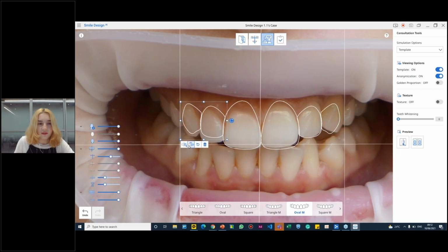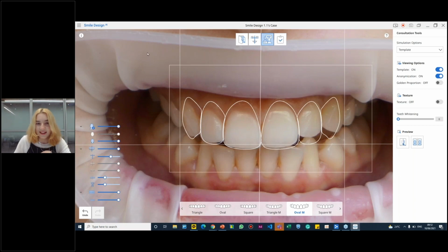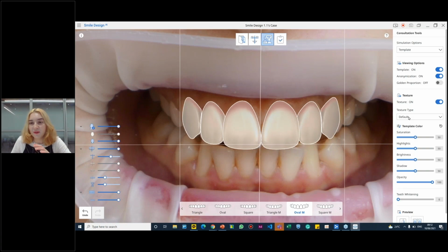So Maria, how did you copy that? What did you click in order to duplicate it or mirror it? Is that what you did? Yeah, so we have 2 options. One is called mirroring. So it changes the design on both sides at the same time. Oh, got it. And then we have this button that copies that design. Perfect. So if I do something like this, it goes back to this. Very good. Perfect.